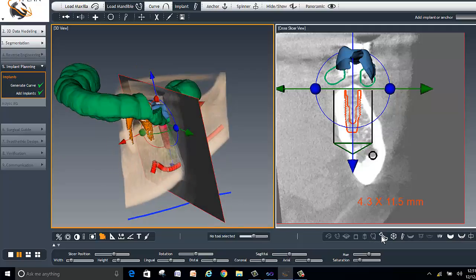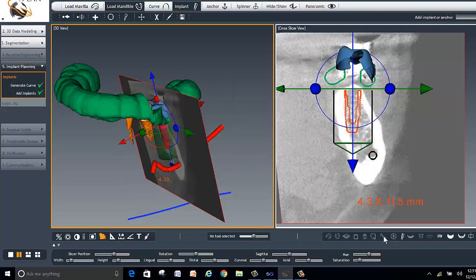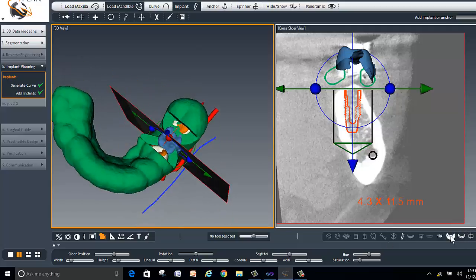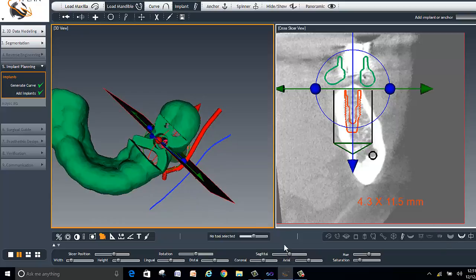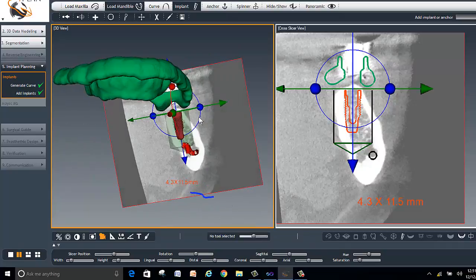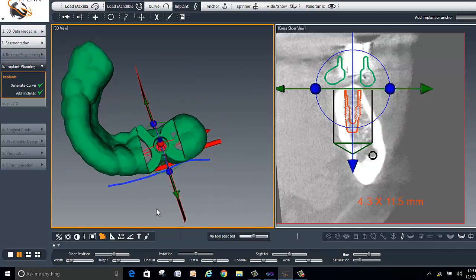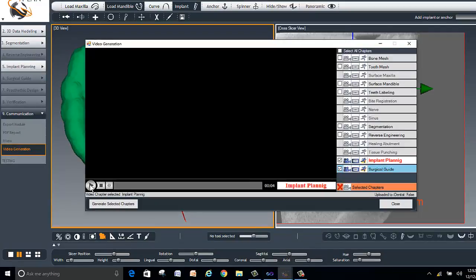I'm going to remove the bone, and I'm going to remove the volume view, and if I remove the teeth that we selected, this is where that implant is going to go through the surgical guide that was designed for this. So we will give you a universal sleeve with the universal drill kit so that you can actually place that Straumann implant in here.